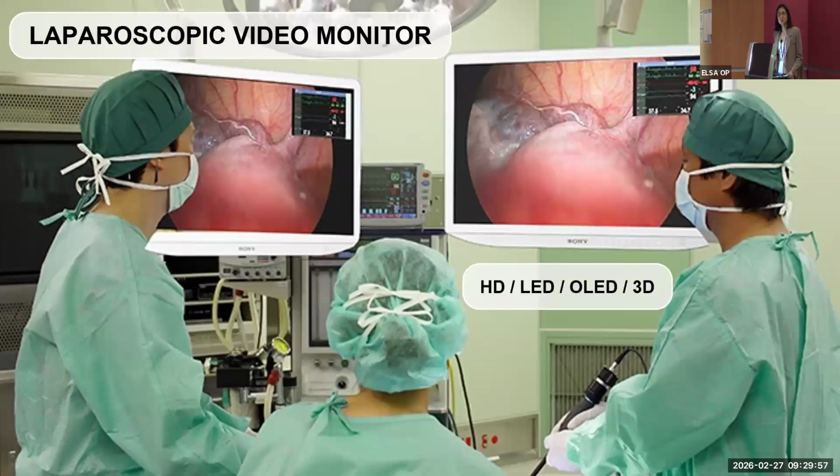Okay, next is what we have, our video monitors. Most of the time we have two, one for the view of the surgeon and one for the view of the assistant. So now we already have HD video cameras. Usually it should be the same resolution as the camera head and the same with the processor enclosure as well.